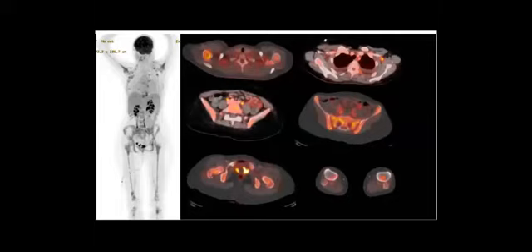Do you remember when we talked about the diffuse uptake? When you find this diffuse uptake in the bone marrow, we mentioned, ask about treatment, right? It can be hyperplasia, and it can be bone involvement. So ask about chemotherapy, it can be hyperplasia. So forget it now.